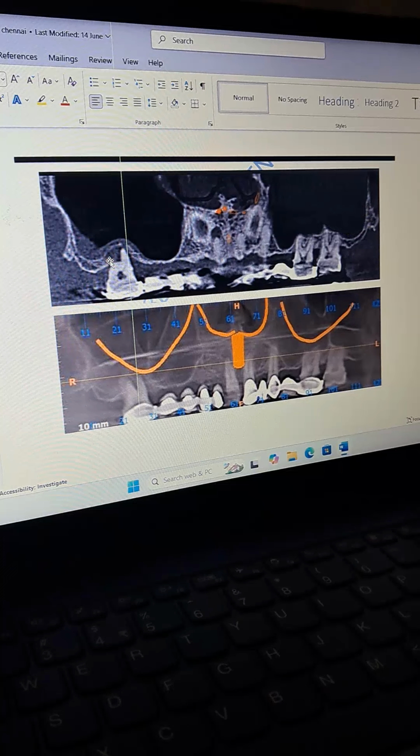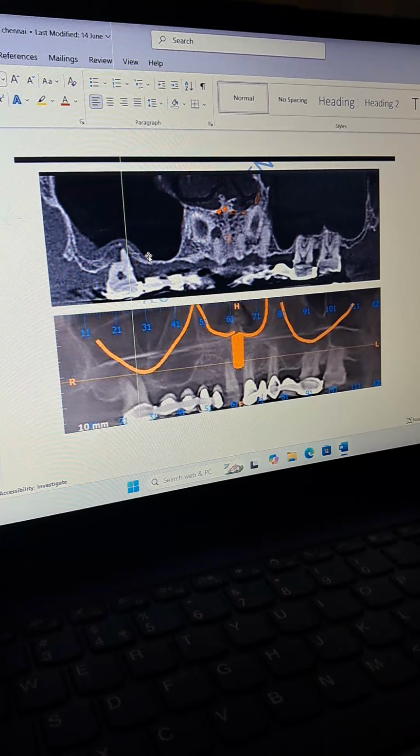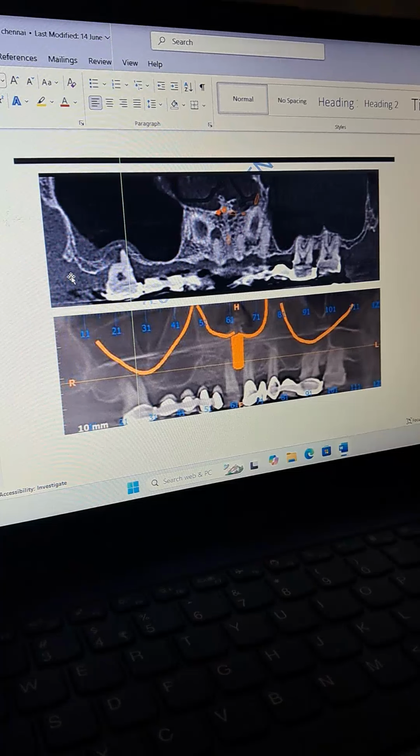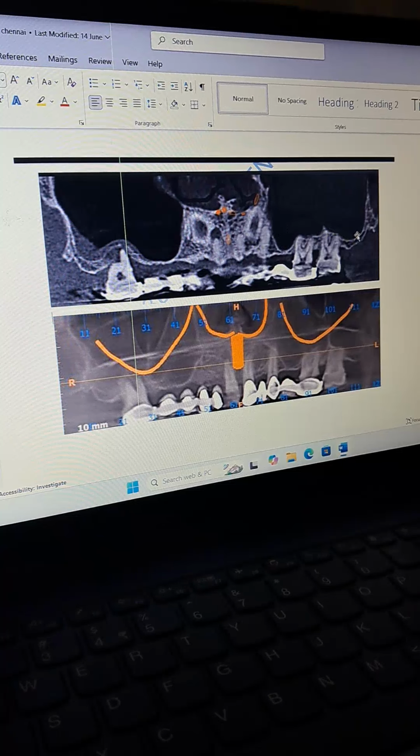In terms of conventional implantology, this kind of sinus lining is beneficial because you get a thick sinus lining. You can do sinus grafting, you can do sinus elevation and all. But at the same time, the sinus floor should be smooth. Over here, if you see, the sinus floor is smooth in nature. On the contrary, here the sinus floor is rugged.